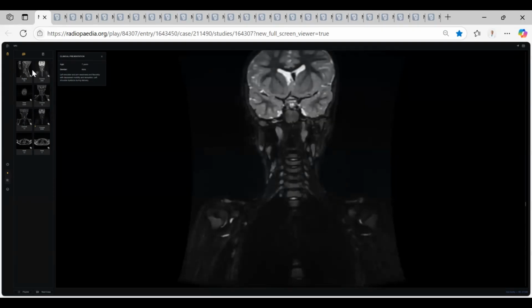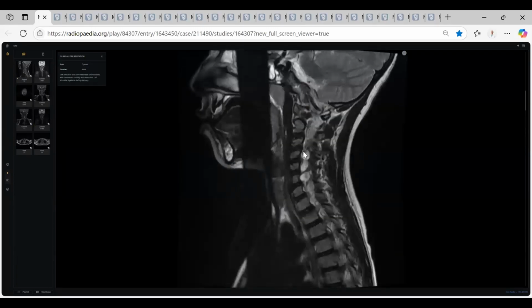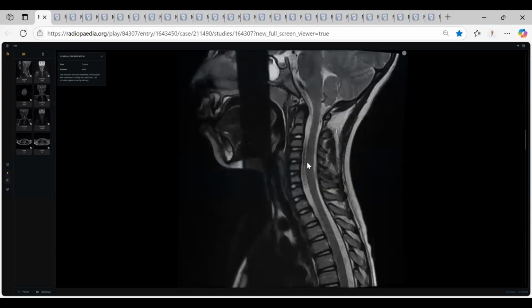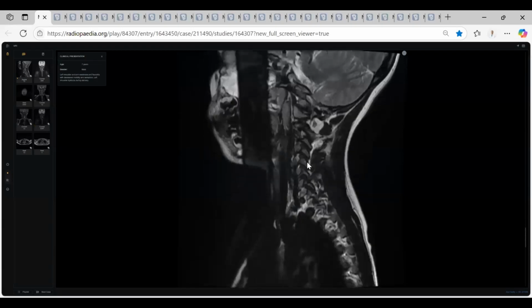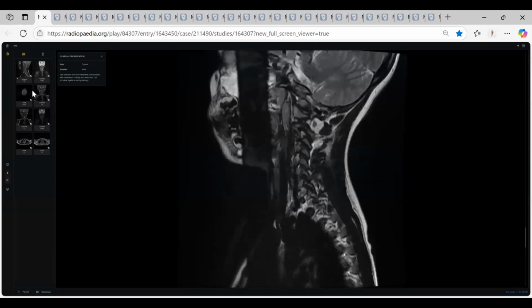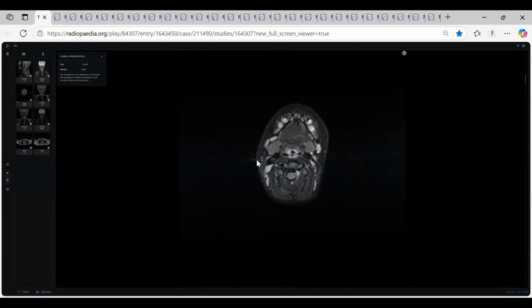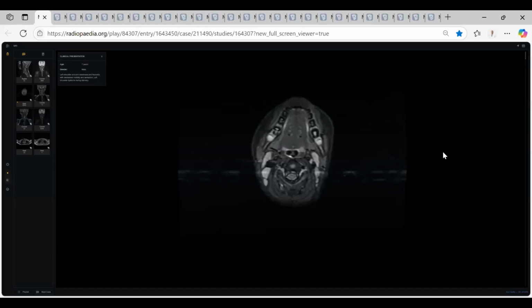If you did very well and picked up some changes here, cystic changes related to the foramen, very good, in comparison to the contralateral side, which is normal, then you ask for other sequences. Take care, my colleagues, this is lymph nodes, and it is very confusing here.